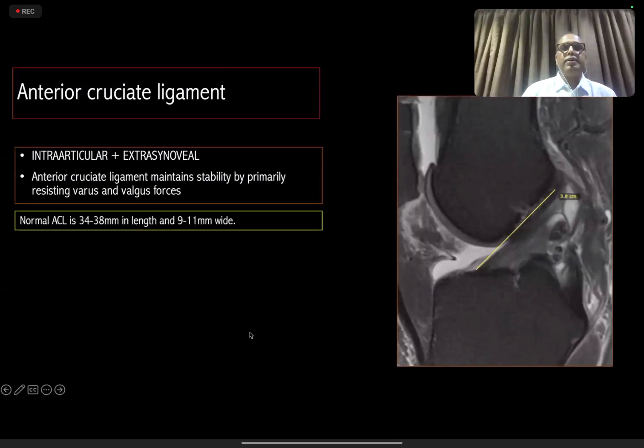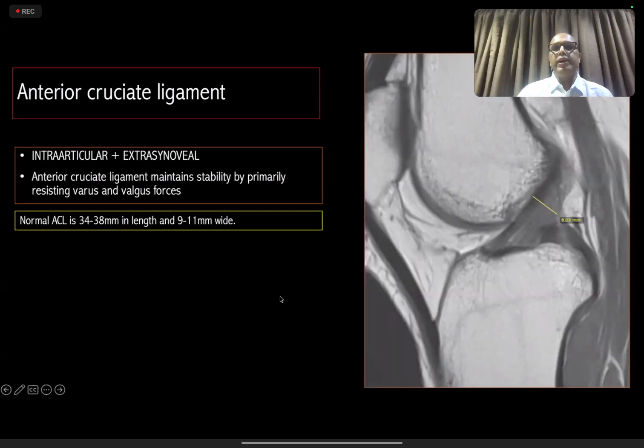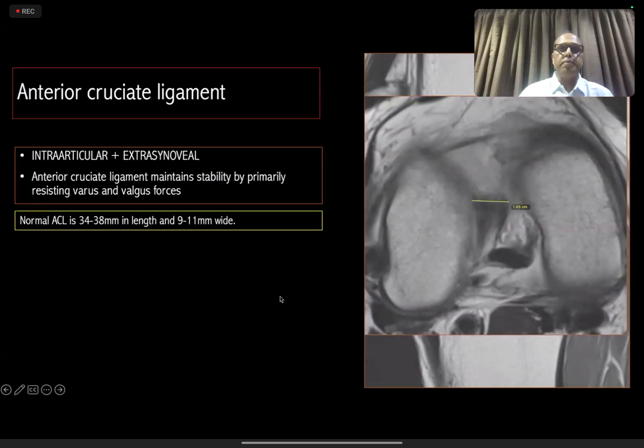So I would always prefer that the basics should be considered once we are dealing with the length and the width of that ligament, because when there are partial thickness tears, we may find that the ligament has excessively increased in length, which creates confusion whether we are dealing with a tear or a laxity of that ligament. So we may know the length and width for our documentation purpose, but not every now and then. If I'm reporting a patient, I would not go over with the scale or start measuring it, but just for information, we should always know where we are measuring that.